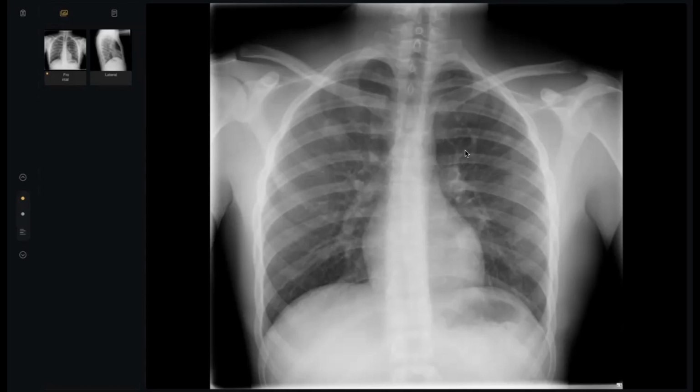I am now tracing the bones to see if there is any abnormality within the osseous structures or any missing ribs, which I cannot assess. As the patient presented with a history of fever, I am thinking about an infectious origin of this radiograph. In my routine practice, I will communicate my finding to the referral doctor, and I will arrange for a chest CT scan for better evaluation.